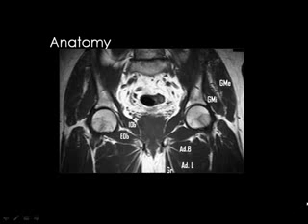In the coronal images, there are three muscles which are very important. They form like a fan, and you see the obturator internus and the obturator externus muscle and the adductor brevis muscle. Actually, these muscles are very liable to injury, especially in the players who frequently use the hip joint in cycling and any other gymnastics.